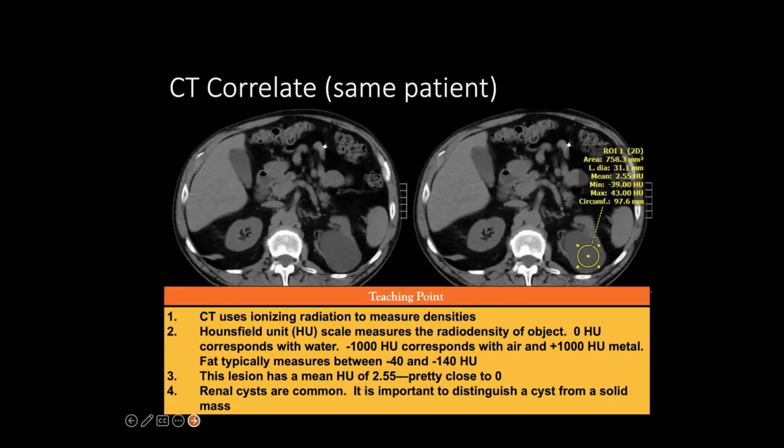And we're going to switch to CT now, talking about Hounsfield units. Again, this is CT. The bones are the brightest thing on the image, like Katie was talking about. We get this dark lesion, left kidney. We use something called Hounsfield units. We get 2, very close to 0. This is water. So water is 0 Hounsfield units on CT.